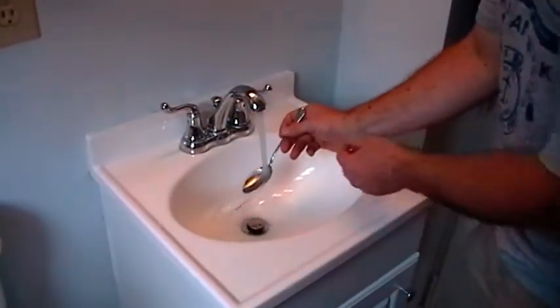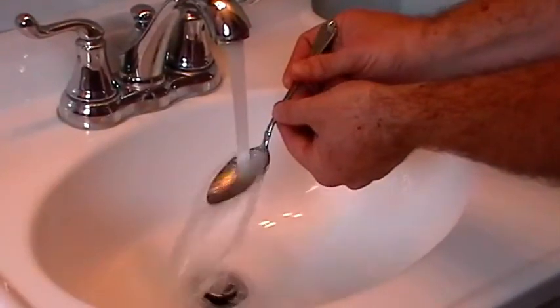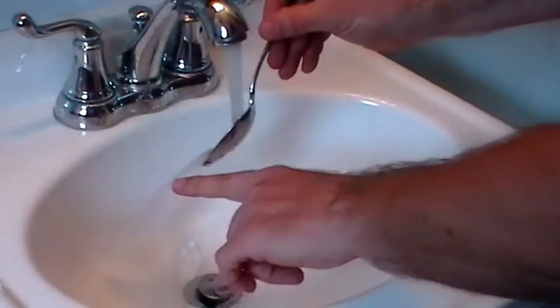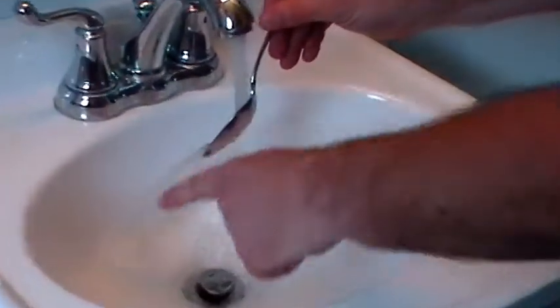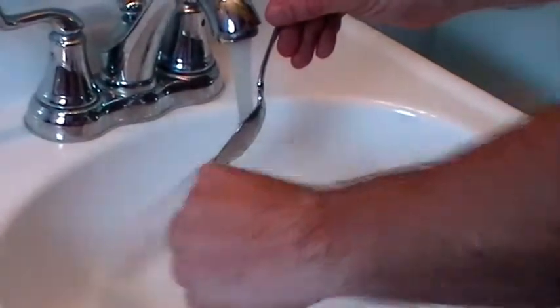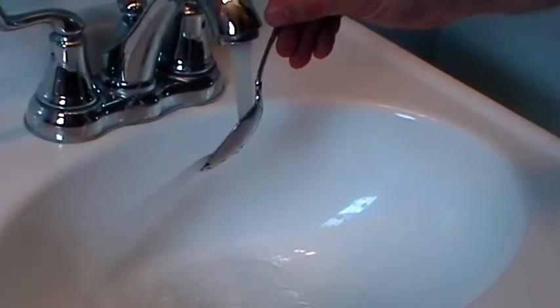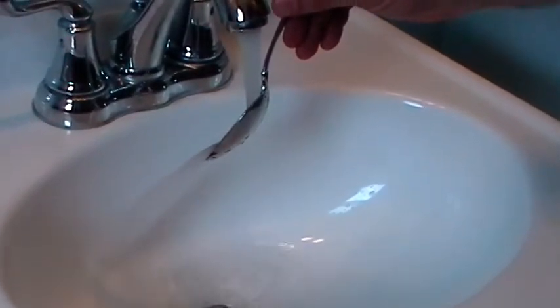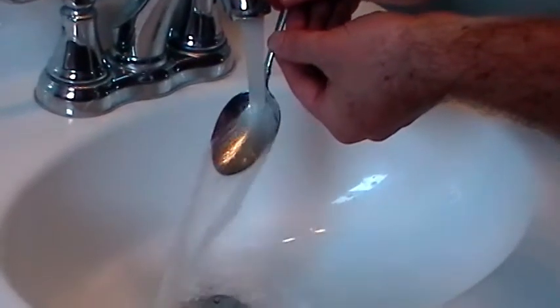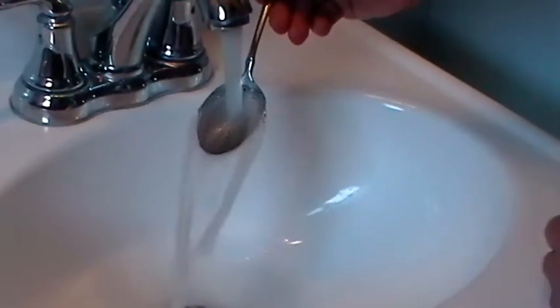and then when I put the spoon underneath and rotate the spoon, you'll see how the water is fanning out over the edge of the spoon. So if you're looking at an ultrasound image of this, and from this particular angle the regurgitant jet is below the edge of the spoon here, you're going to see a very thin jet, and you won't quantify or qualify it as a very large jet with color Doppler when you see it from that angle. But if you rotate it 90 degrees, you'll notice that the jet gets much wider and would look much bigger.